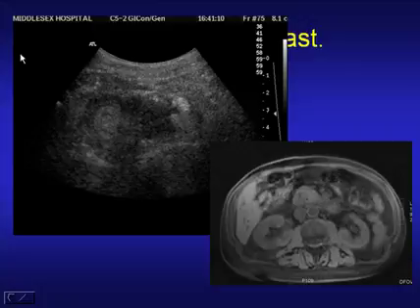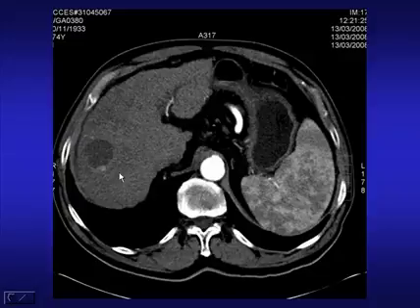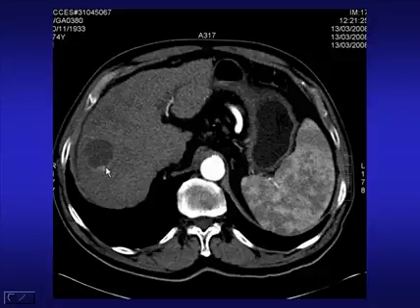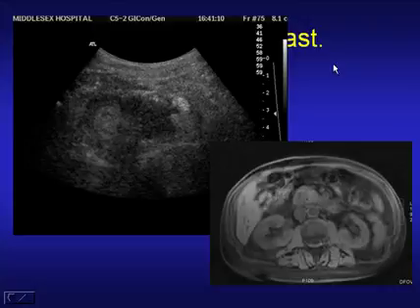We can use this quite effectively with ultrasound contrast to control the effectiveness of our radiofrequency ablation and pick up quite small nodular areas and determine whether or not there is residual tumor which we need to go back and treat. So in my practice now, ultrasound contrast is fairly routine in liver imaging, wherever we're trying to detect or characterize focal liver lesions, and particularly for controlling biopsy or radiofrequency ablation techniques.